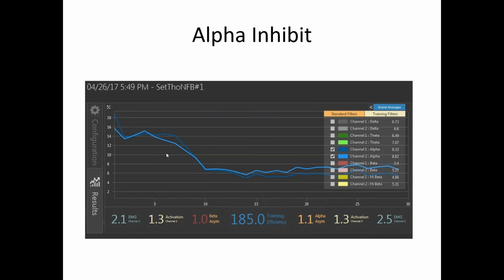And so you can clearly see in this trend screen that just training one frequency band, the other frequency band, and one side of the brain, the other side of the brain, that it all responds as a system. And you can see it moving from 18 microvolts, which is outside of normal range, into in between 4 and 12, and it's actually around 8, maybe 7, 8. That's probably where it should be for alpha. And notice we're getting this pattern here, and then we're getting this pattern where it goes below what's normal.